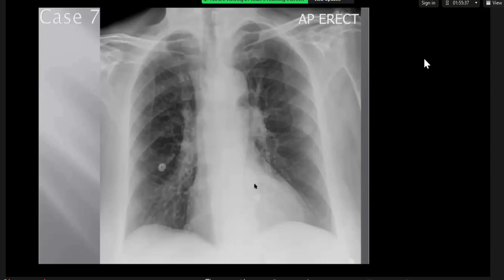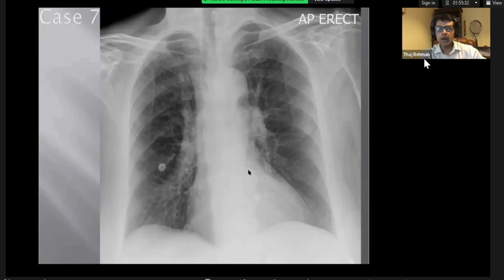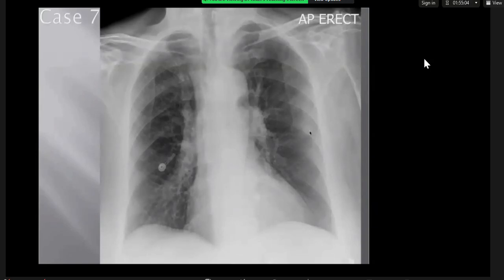Those structures close to the spine, I would be a bit more careful before calling that a lung abnormality. It could be spine. You do see quite a lot in these areas, and you get confused whether to call it. I would be a bit more cautious on calling something that may be a transverse process bony structure. Anyway, you correctly picked up the left mid lung nodule. That was the abnormality to be picked up.